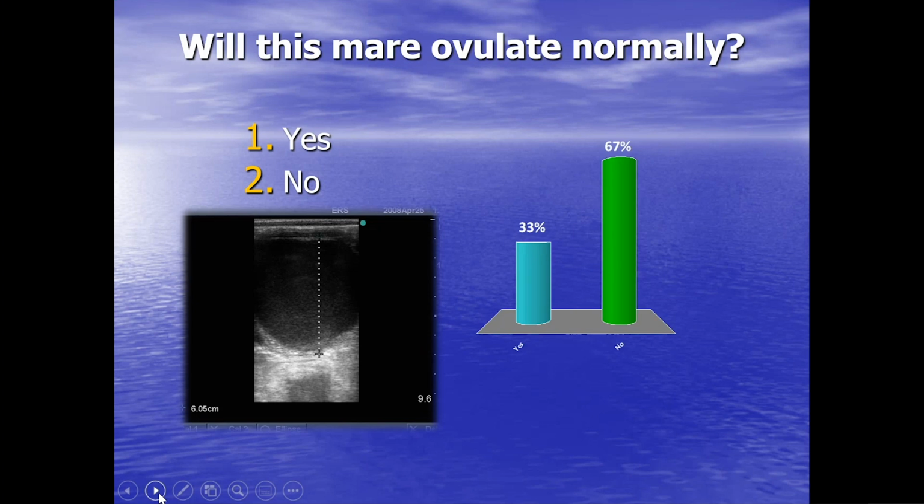So it's all a question of degree. Everybody talks about anovulatory hemorrhagic follicles being when these echogenic particles are appearing. But it's very hard to say with absolute certainty whether a follicle is normal and just getting close to ovulation, or has indeed become a hemorrhagic anovulatory follicle.